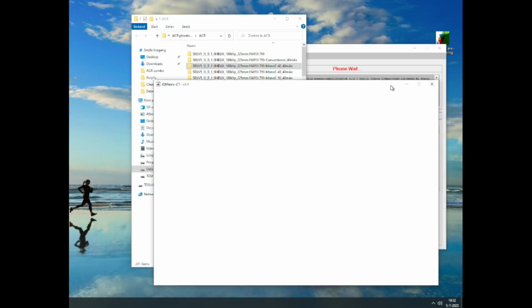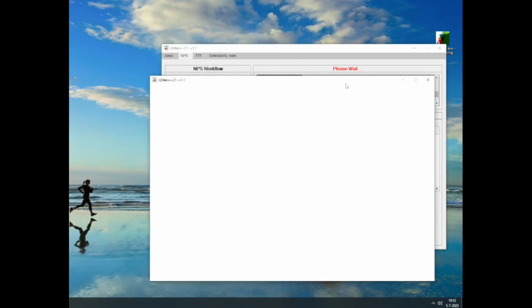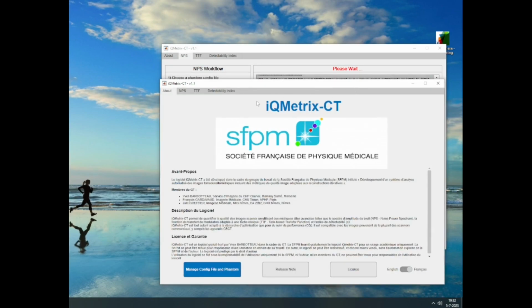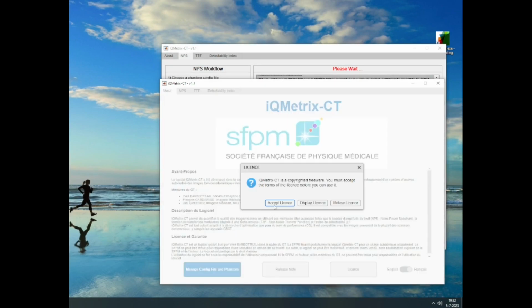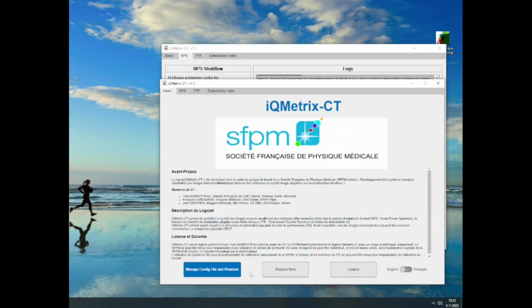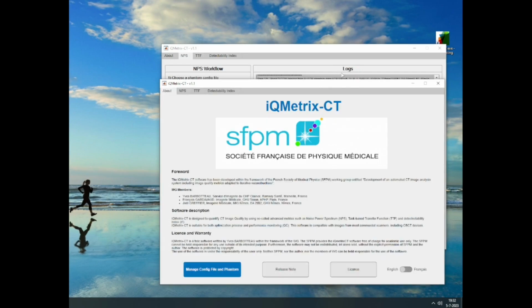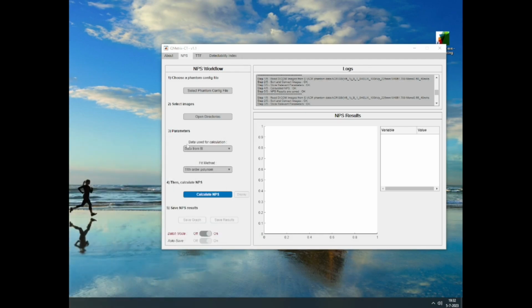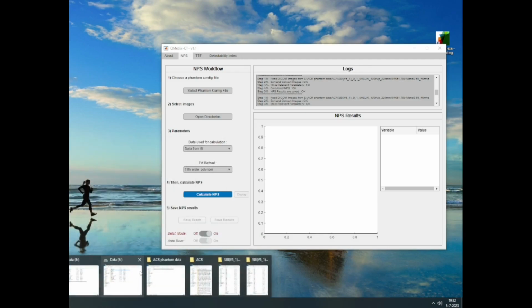So that's the same thing what we're going to do. I will let that one run in the background. Alright, so now I will create the JSON file for the, yes, alright, well it's done. Alright, so now you see logs, so please wait isn't there anymore, so you see log. So now I will show you again the data, and I will show you what I mean.